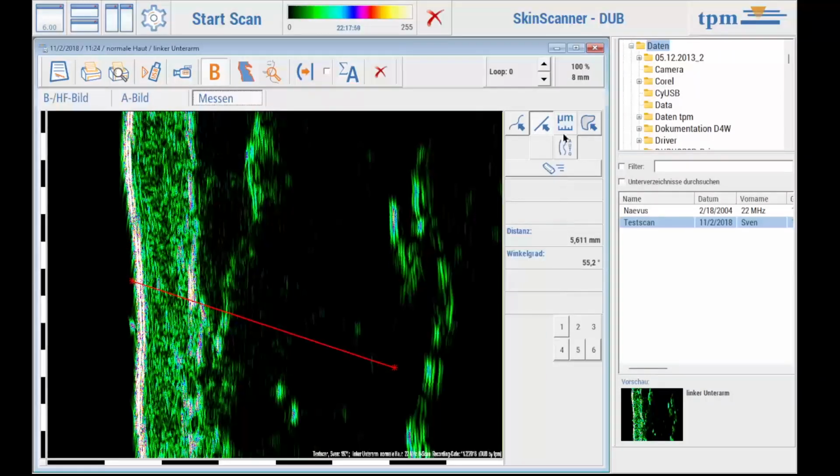The icon one field further is the freehand shape. Go back into the image, hold down the left mouse button and draw a freehand shape. If you leave the end open and simply release the mouse button, the program automatically connects the beginning and end with a straight line.